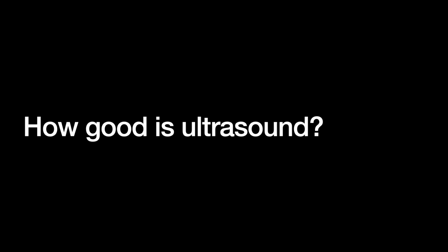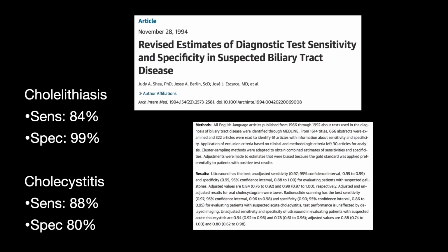So if we take a walk down history lane here, the first study we're going to look at is from November of 1994, right?